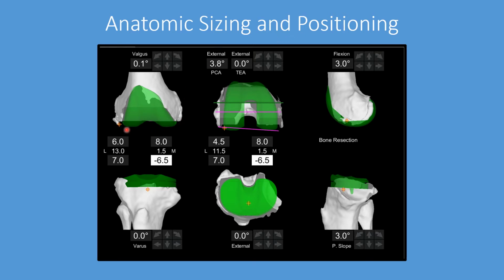And so we can get a clear idea of the extent and the area of the deformity. When we look at the femur from the front, from the axial view, and from the side, we can see there's arthritic change, but there's not a lot of deformity. The femur has maintained its shape. In this knee, all the deformity is happening on the tibial side, especially in the medial side. When we look axially, we can see healthy bone everywhere, but this entire area of bone is missing.